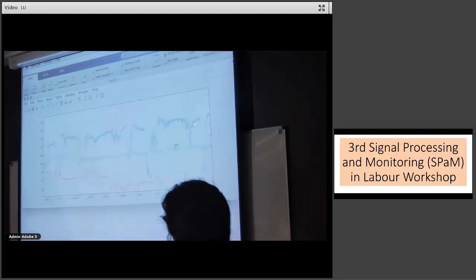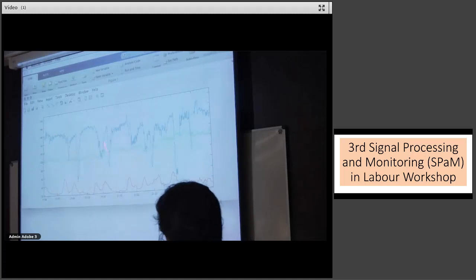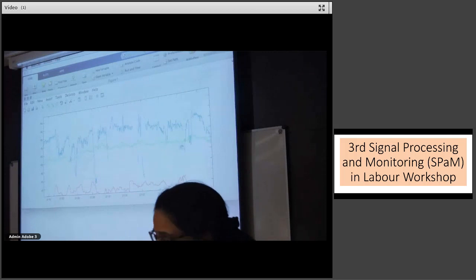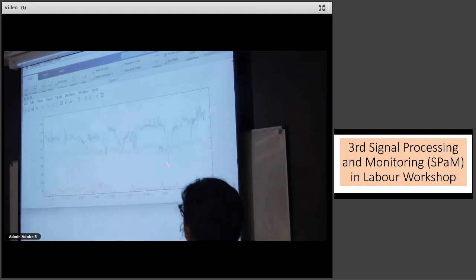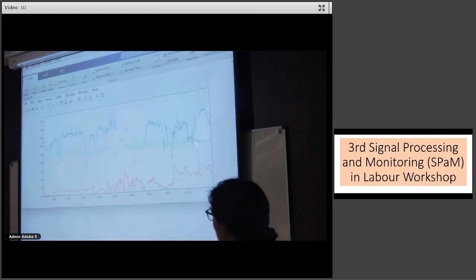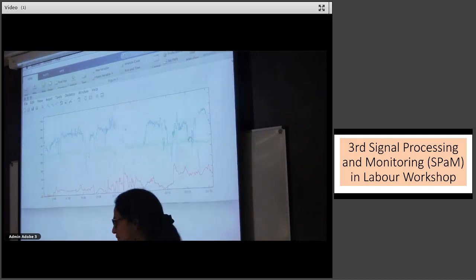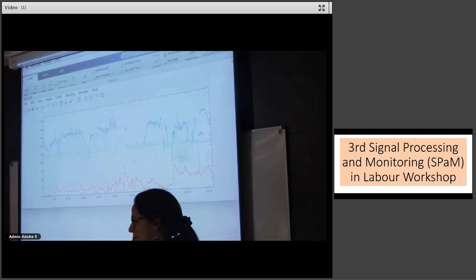So apparently they decided to carry on with management. Quite rightly too. You have oxytocin. And actually, there is a rise of the fetal heart rate baseline now. We started at 115. We are now at 160 beats per minute. And for some of those, there's no recovery before you go into the next one. So these are the features that, at least I'm suggesting, connote the potential for problems, because you're not allowing the baby essentially to recover.